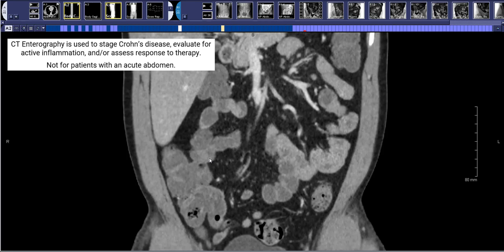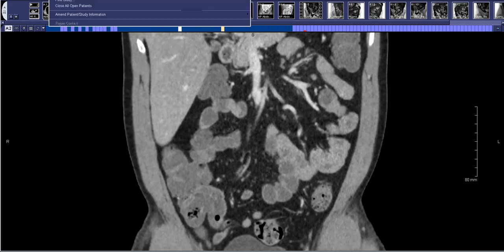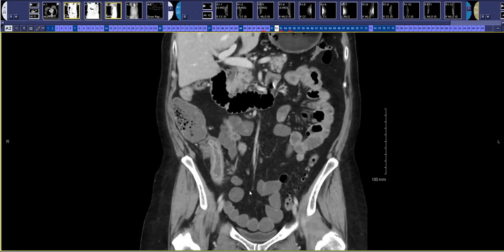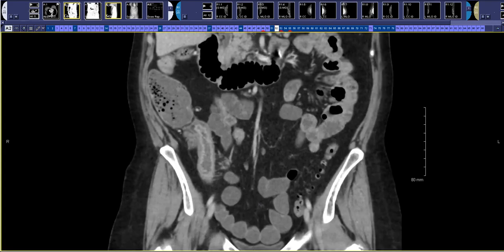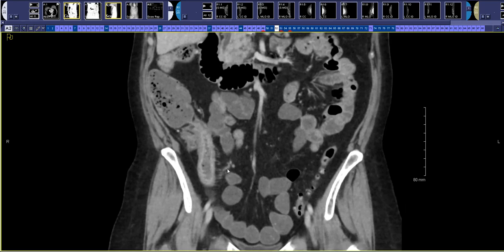So they would get intravenous contrast but no oral contrast, because you wouldn't want to wait to give them the Volumen, which takes a period of time, over an hour, to get in and maximally distend the bowel. So this is only in the non-acute setting. I'm going to show the case of a known Crohn's disease patient just to give you an example of a positive scan. This was a coronal image obtained after drinking Volumen, a negative oral contrast, and after IV contrast.